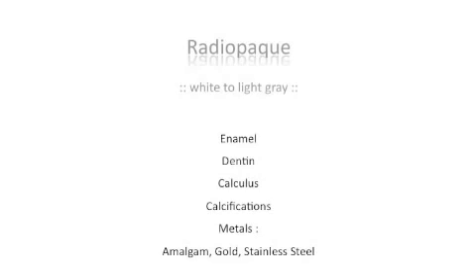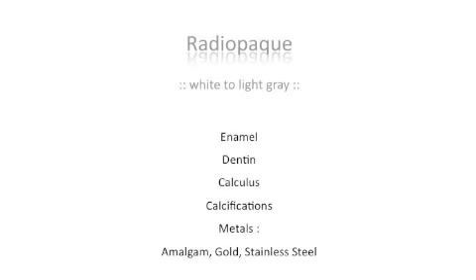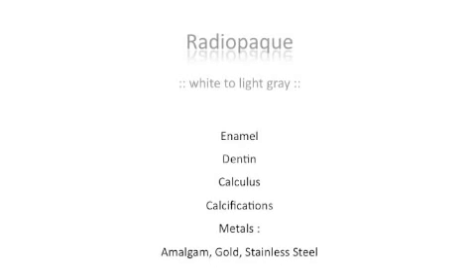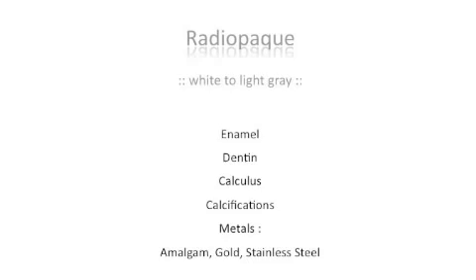Here we have a list of radiopaque structures. Calcifications can refer to calculus, bone, pulp stones, any calcified or hardened structure.